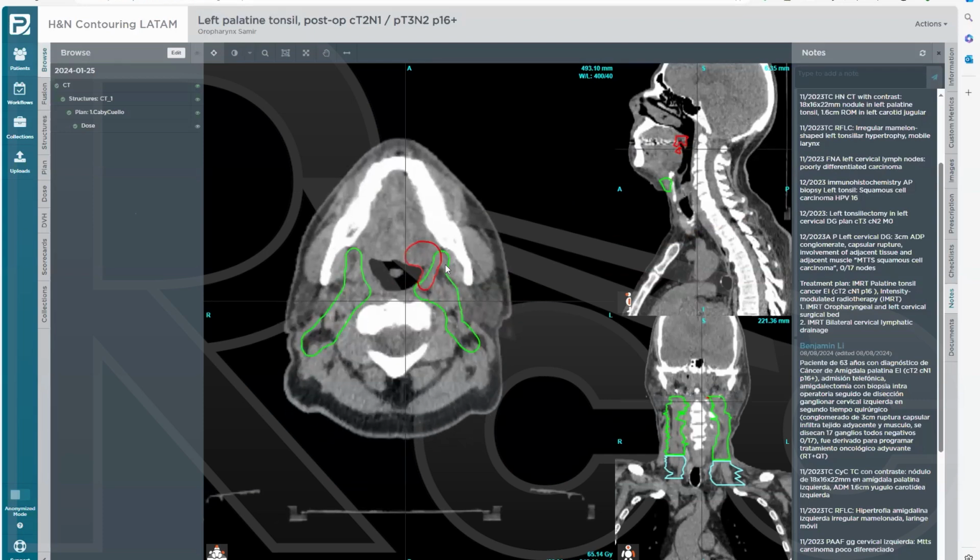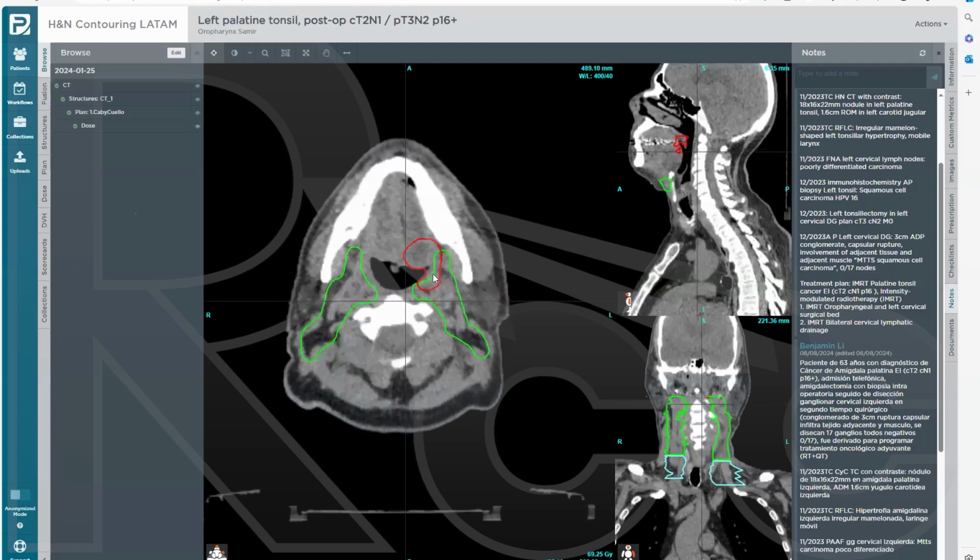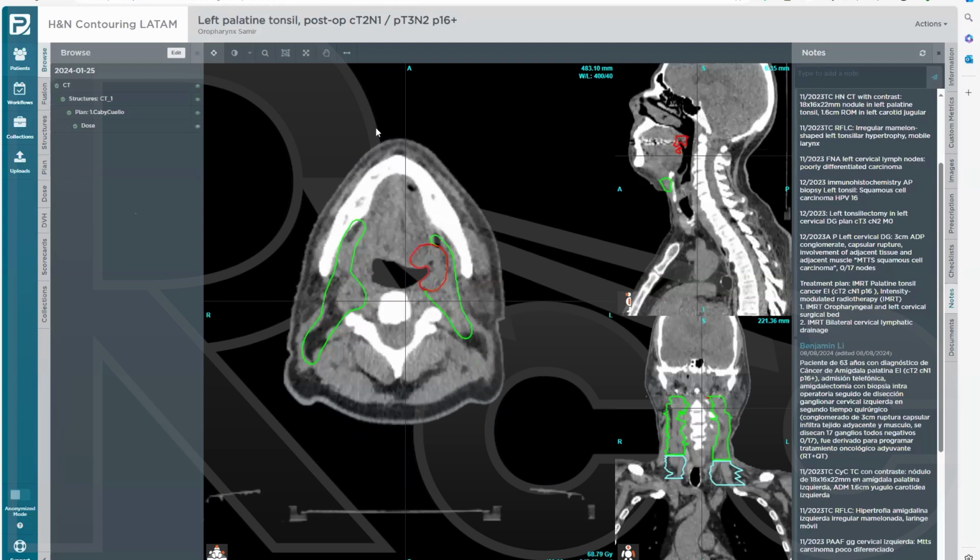And here, you're probably including part of the parapharyngeal space because this is a tonsil tumor. But down here, when I said, let's draw level 2, I think most of you are very good. When we're drawing level 2, this is my main consideration here. I'm including the sternocleidomastoid muscle here because there was a rupture here. So, excellent.